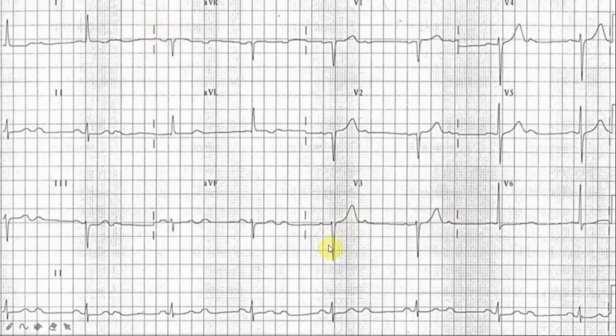There is poor R wave progression in V3, which may be due to myocardial ischemia. Now, to compile all this information together, I am of the impression that the patient has a fixed ratio second-degree AV block. It is challenging to state if it is Mobitz type 1 or Mobitz type 2. Further electrophysiological studies may be mandated.